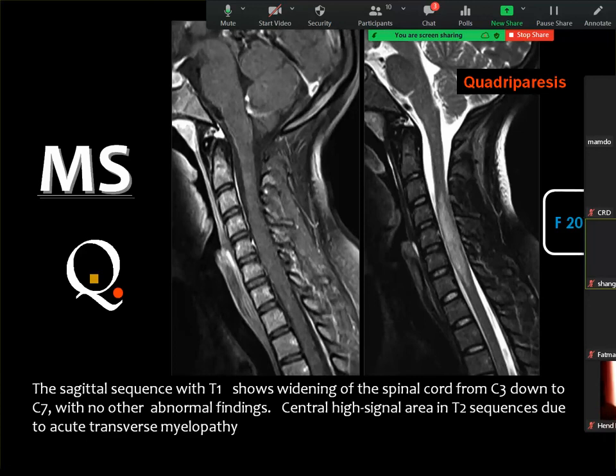But this lesion, although it's not a classic lesion for MS, but MS is one of the possibilities of an abnormal bright signal in the cord, especially if it is less than 3 vertebral segments. As you know that neuromyelitis optica involves much more substance of the cord and may extend for more than 7 vertebral segments. Then if you see an abnormal signal within the cord and you don't have the post-contrast study, or you have it without enhancement of the lesion, then you think of transverse myelitis or MS, especially if the segment of the cord is short.